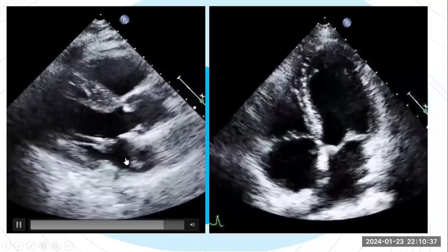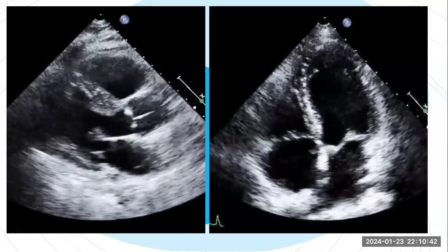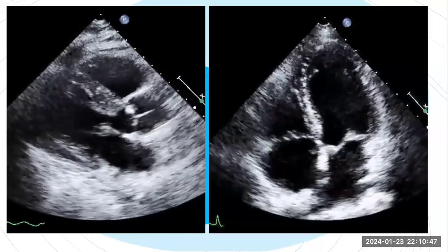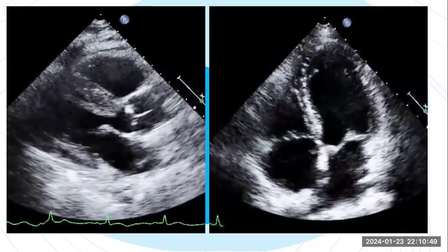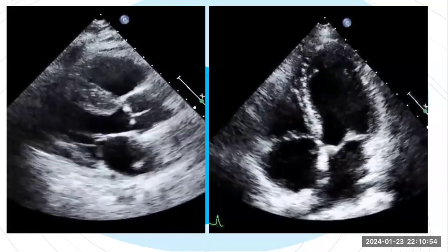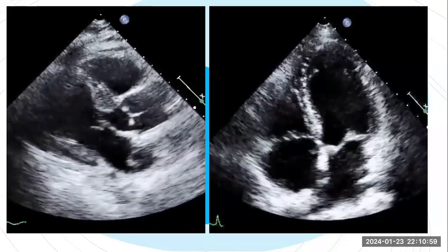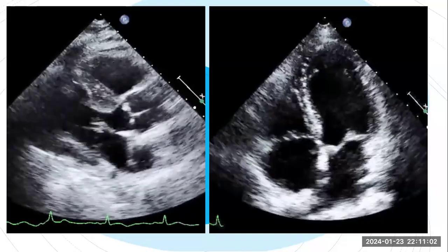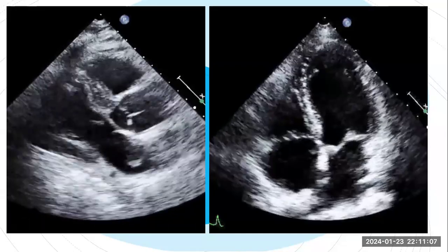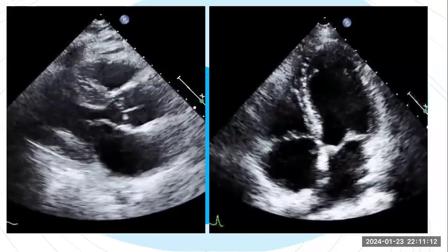There is something inside the LA, am I right? So is there an LA mass? Is this like a membrane inside the LA? So what are we dealing with here? Not thrombus. Okay, could be thrombus. So do you agree that there is a mass inside the LA? There is also a mass in the aortic valve, or it's thickened, I think.